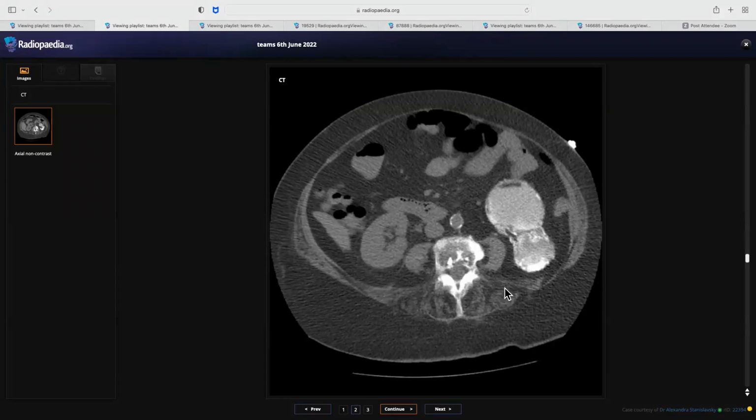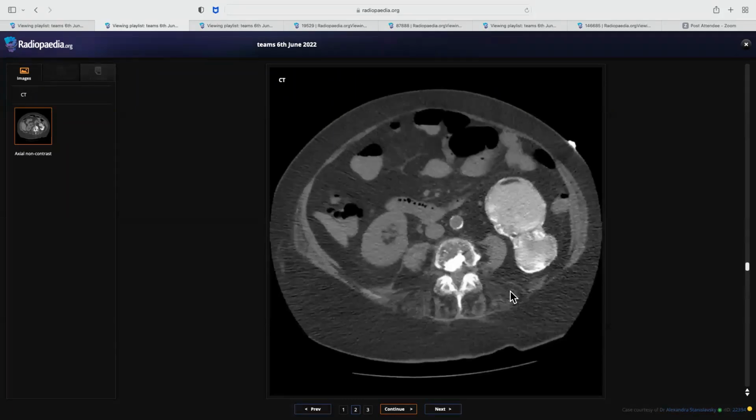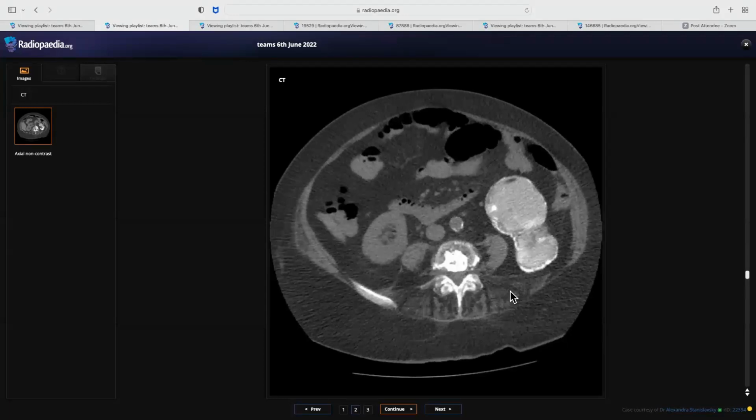Yeah. The patient had some infection a long time back. Though they don't have the history, they just told they had some infection in the chest. So in that case, I would suspect pulmonary tuberculosis, and I would inform the findings to the referring physician and recommend CT chest if possible, to rule out pulmonary tuberculosis. And I think this is a putty kidney, putty kidney of the left side.